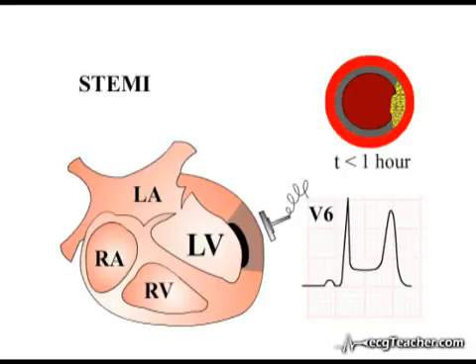In the absence of treatment, peaked T waves and ST segment elevation are followed by alterations to the terminal portion of the QRS complex. As in this example, in a lead in which the QRS complex ends with an R wave, the R wave rises in amplitude. In contrast, if infarction occurs under leads in which the QRS complex ends with an S wave, the S wave may disappear. These transient changes to the terminal portion of the QRS complex reflect worsening crisis in the oxygen-starved ventricular wall and probably result from progressive ischemia and necrosis of the Purkinje fibers, a tissue more resistant to death than working muscle.